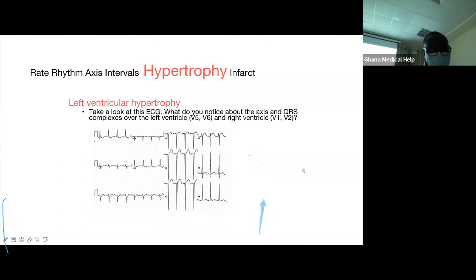If you decide to go with the most accurate one, you can use V3 plus, what is V3, V1, V2, V3. So if you look at the S waves here in V3, and then you combine that with the R waves in AVL, more than 20 for women, more than 28 for men, then we were able to satisfy that criteria.